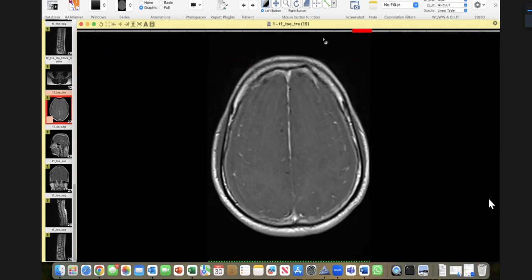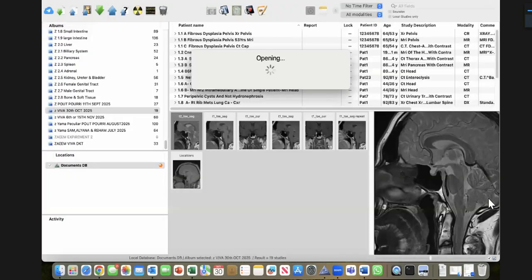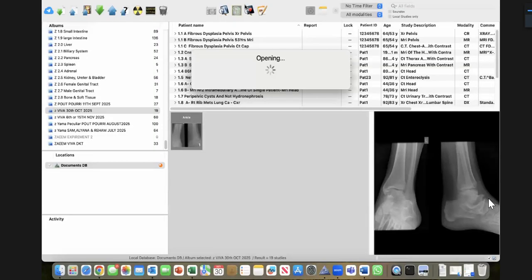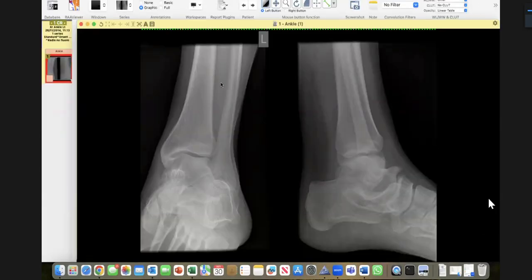So this is a case of intracranial hypotension, and that is causing the patient's symptoms, with engorgement of the venous sinuses, sagging of the brainstem and diffuse pachymeningeal enhancement. I will inform my finding to the referring physician, yes, sir. And would advise entire neuraxis MRI for further evaluation and to rule out the cause of that CSF leak that is leading to this condition.